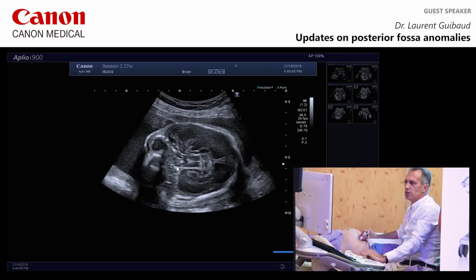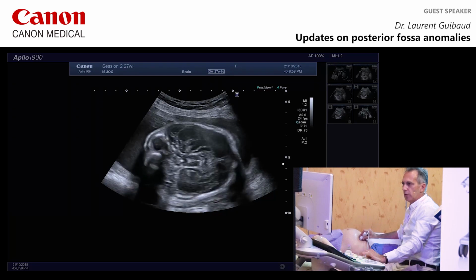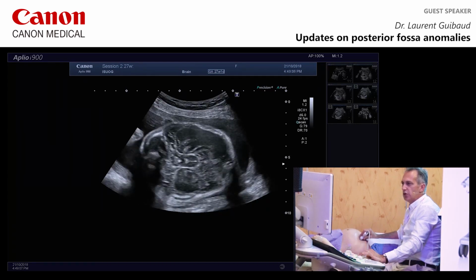But to measure the optic nerve and say if it is normal or abnormal, it's very tricky. I know that Jean-Philippe Bault has a good presentation about the optic nerve using 3D, and I think we can do that without 3D, but the main issue is to be sure if it's normal or not, and they are very subjective measures, in fact.